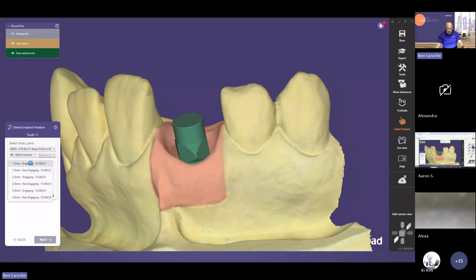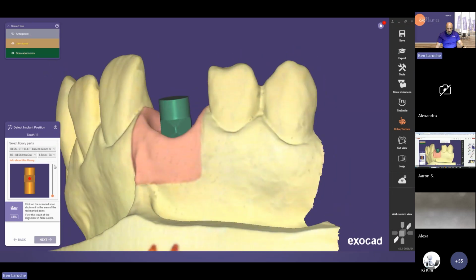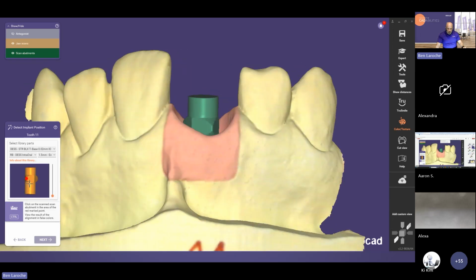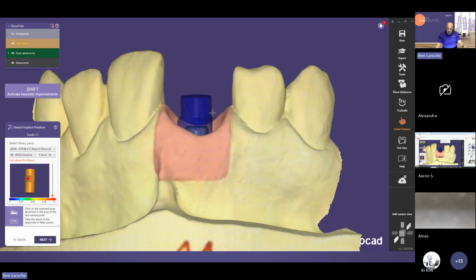And let's go here. Now from here, I see a nice little red dot, and I have to find that exact spot. Now I can rotate this by holding down right click and moving it, just like I can on the screen. Same controls, and I can zoom in, zoom out. I'm just looking for that exact same spot, which is right here. And then I can see that it's a perfect match.